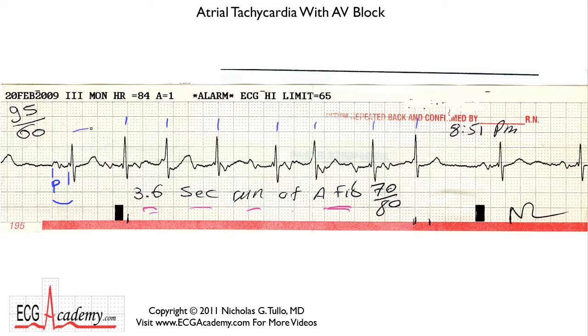Well, if we look at this R to R interval and we scan around, we see a nice T wave here, and then there's this sharp deflection right here. This would appear to precede this QRS complex. So this sharp signal, remember P waves have high frequency components to them as opposed to T waves. That sharp deflection is a P wave. I don't see any other P waves in here. And this conducts with a first degree AV block to the ventricles here.